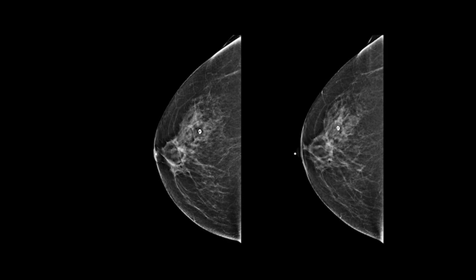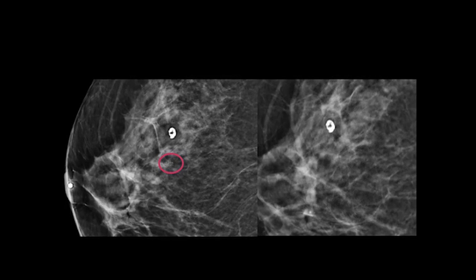So it's very important, as we know, mammography to find breast cancer at the earliest stage possible, where the patient doesn't have to have such extensive treatment. So yeah, that was very subtle, and it's a great example of missing cancers, where the tiny cancers can be missed in motion.